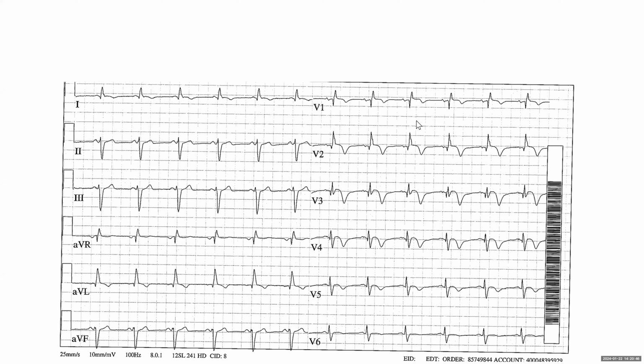Why not intracranial hemorrhage? Because intracranial hemorrhage can give you giant T-wave inversions and prolonged QT. You don't get this ischemic right bundle with ST elevation with intracranial hemorrhage. Anteroseptal, yeah, correct. Anteroseptal is correct. Good. Any questions about this ECG? No. Okay.